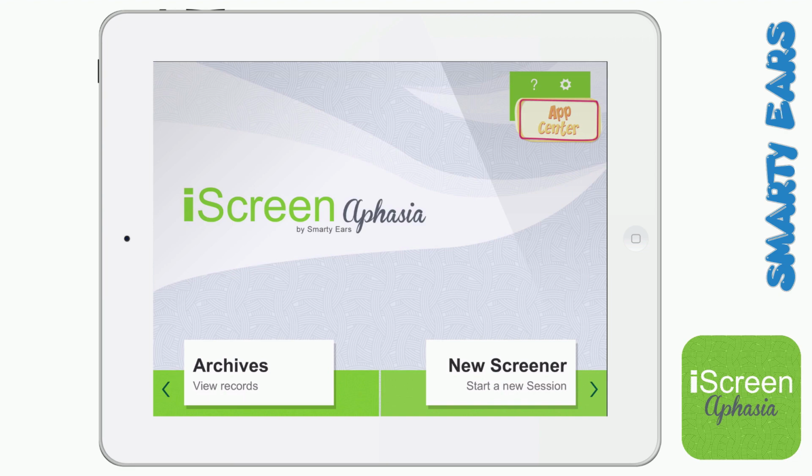The goal of this video is to guide you, if you already own the app, on how to use the application. And if you don't own the app yet, I hope this video will help you decide if this app is a good fit for you. So let's get started, and we are on the main screen of iScreen Aphasia.